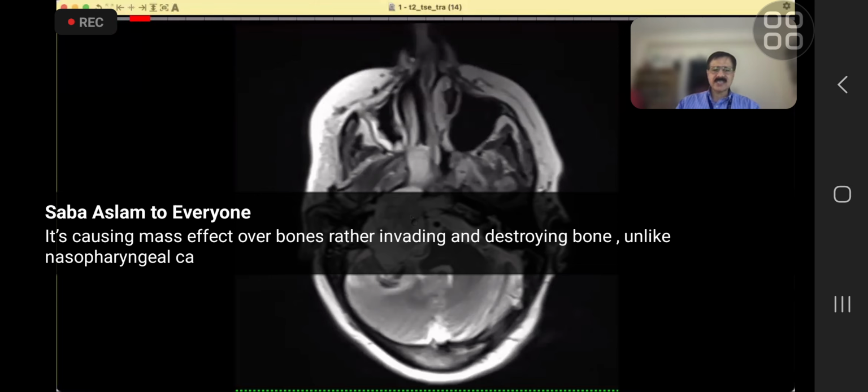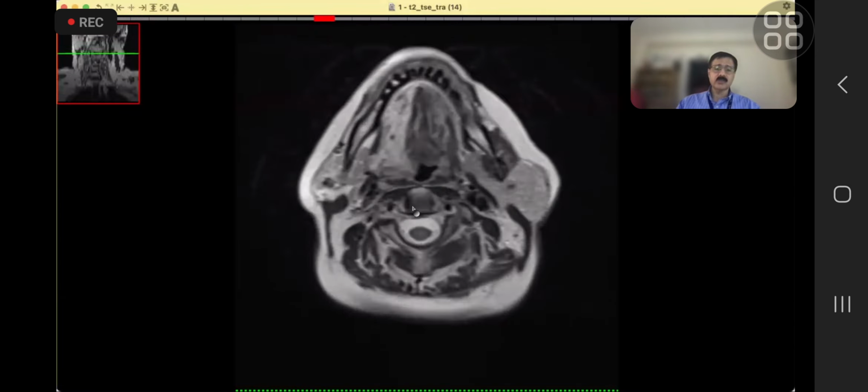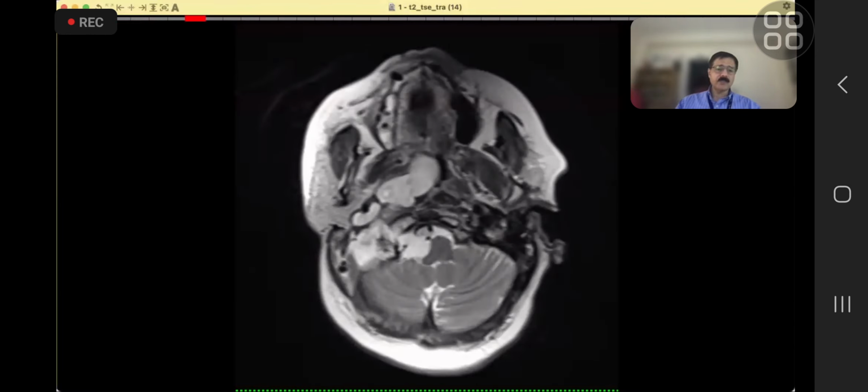So this case per se has come in the exam, I warn you. Jugular base of skull lesion with epicenter in the jugular foramen in the carotid space, and with that motor denervation. So it's a very busy scan.